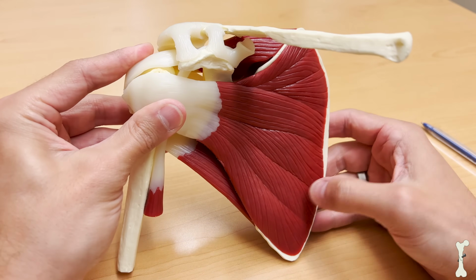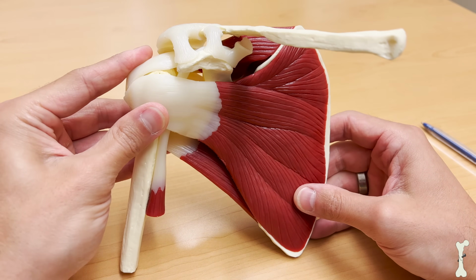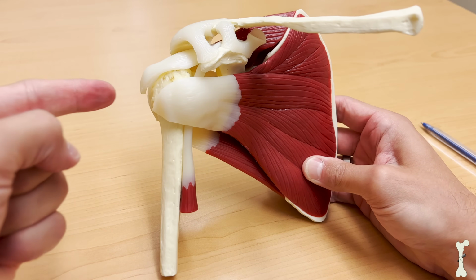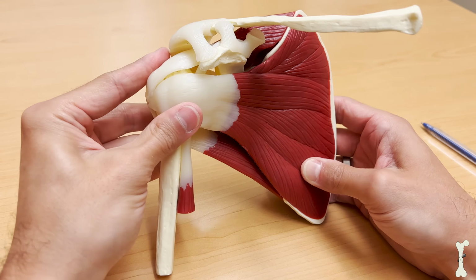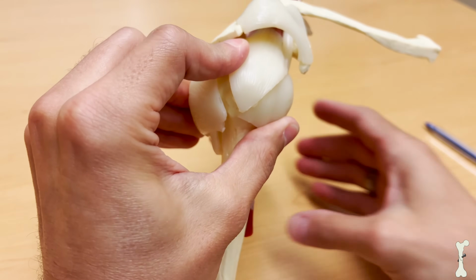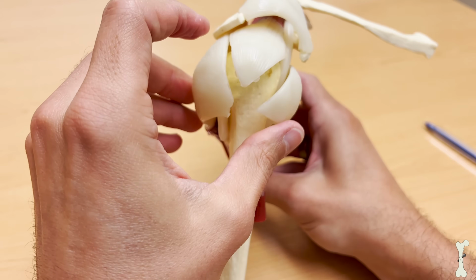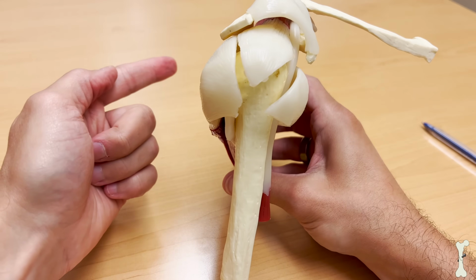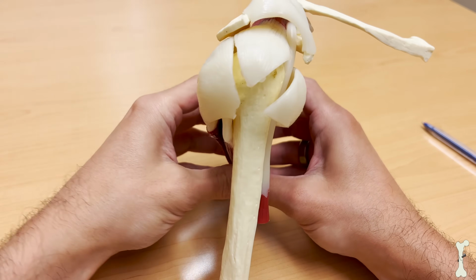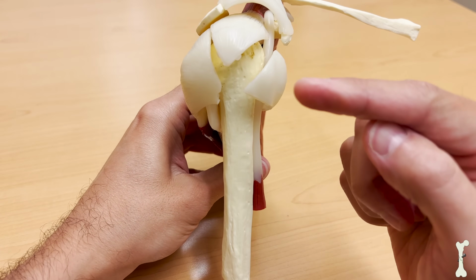This final sequence is called the sagittal view, and this is the view when looking directly into the side of the shoulder like this. And so to get a look at that, we'll rotate the shoulder blade like so. And if you notice, we can see the rotator cuff muscles coming out towards us, and here in the front as well.